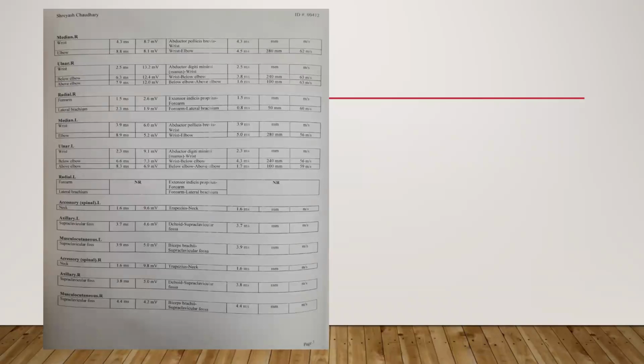So what do you think this is? This is not cortical. It is peripheral, because if you have a low CMAP or absent CMAP, it is always LMN. In UMN, the CMAPs will be normal. Okay, so this is LMN, but the SNAPs are preserved. So it could be a pure motor involvement, like the posterior interosseous nerve.